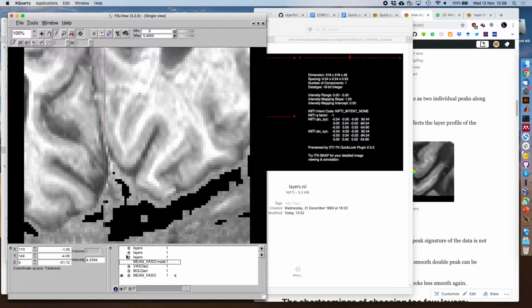So that our data will be more... Right. That's what I was talking about. For that kind of definition, I need the layering. Right. I think it's rather independent, right? The layering, you can extract the layer.